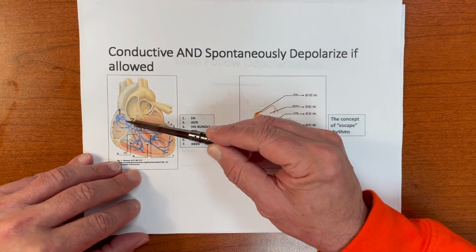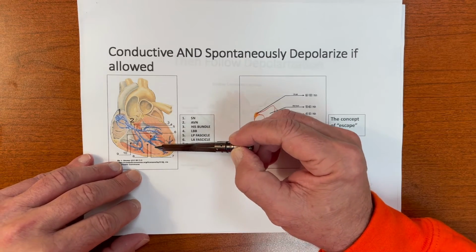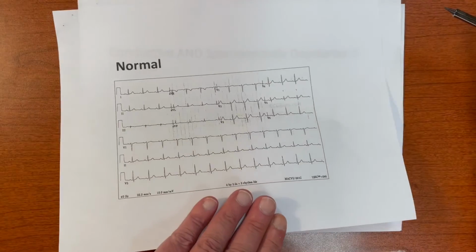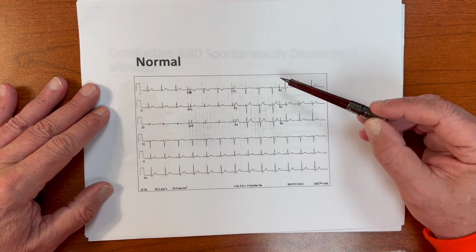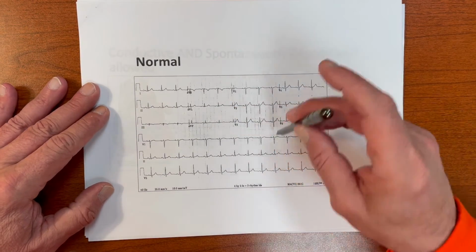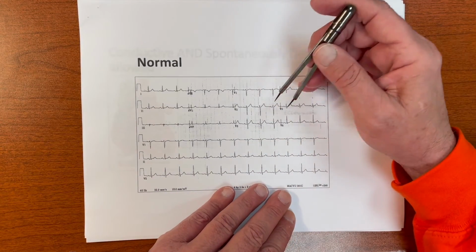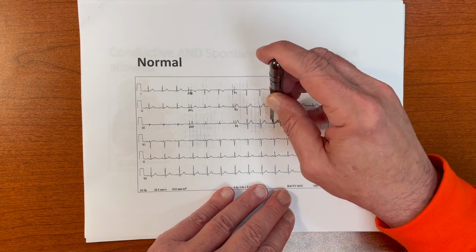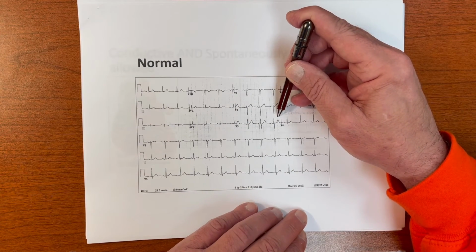So when this transmits efficiently through the conduction system, then into the muscle, you have a normal EKG, a normal tracing, a QRS. This is reflected by the QRS, all right? And we see here that the QRS normally looks nice and neat. And if we could measure this, we would see, and I'm sorry for the scale on this EKG, we could actually change it, but we can see that the normal QRS is less than 3 boxes, 0.12, all right?